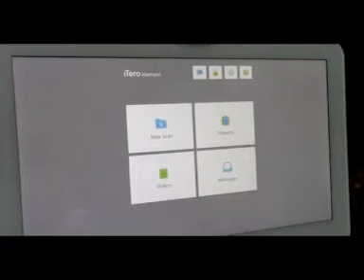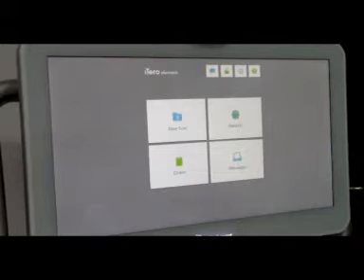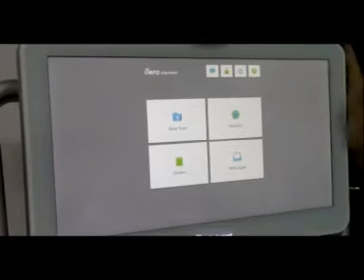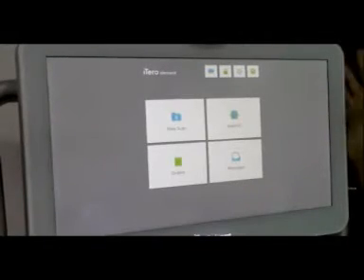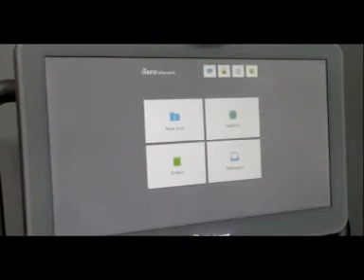Everything is mirrored onto and sent to the cloud storage, and the name of the cloud storage is myitero.com. And you use the same login details as the iTero to log into the cloud. Okay.